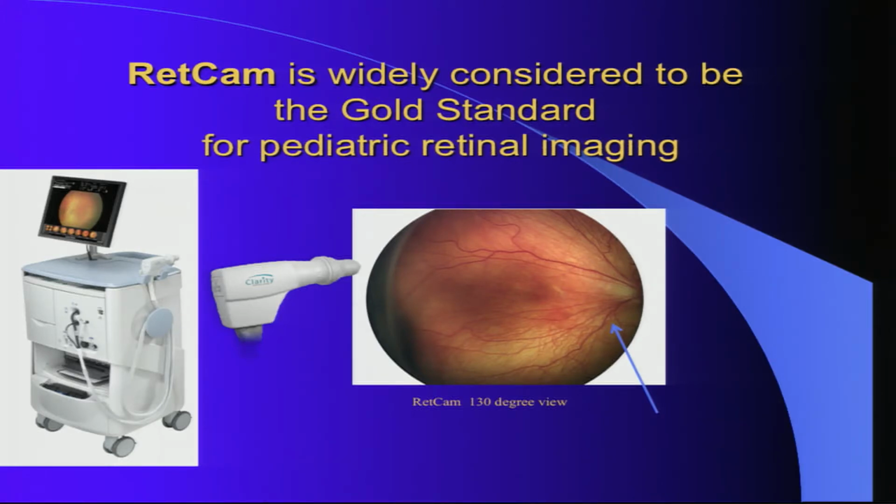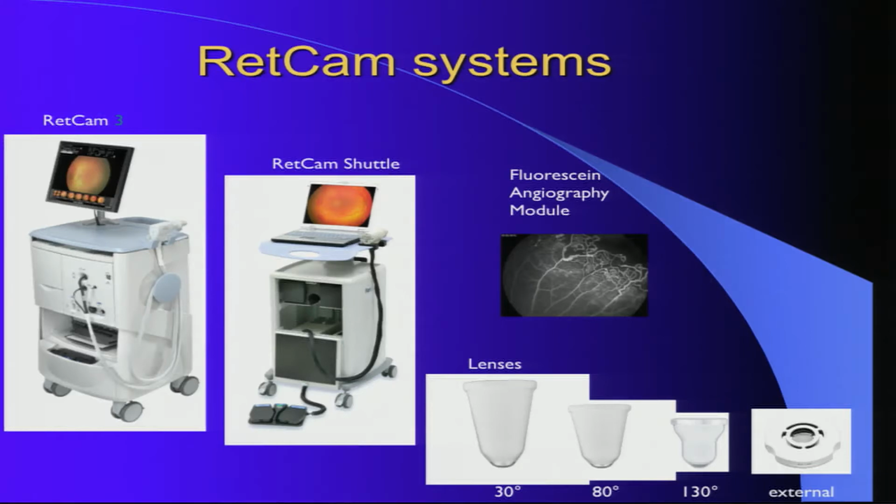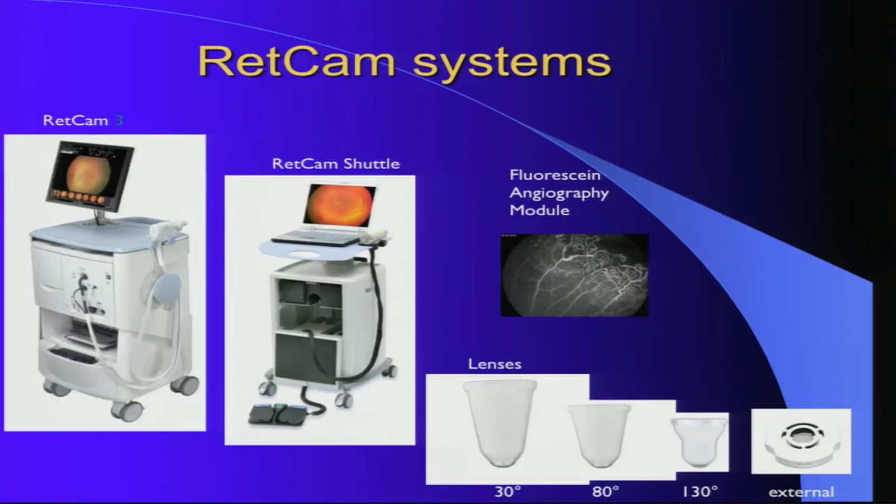It is widely used all over, especially for imaging the retina of the infant, and also in pediatric retinal imaging. Usually 2 are available. One is what we call Retcam 3, where you can also do angiography, and you have Retcam Shuttle, which is more portable. I think it's moving of its own.